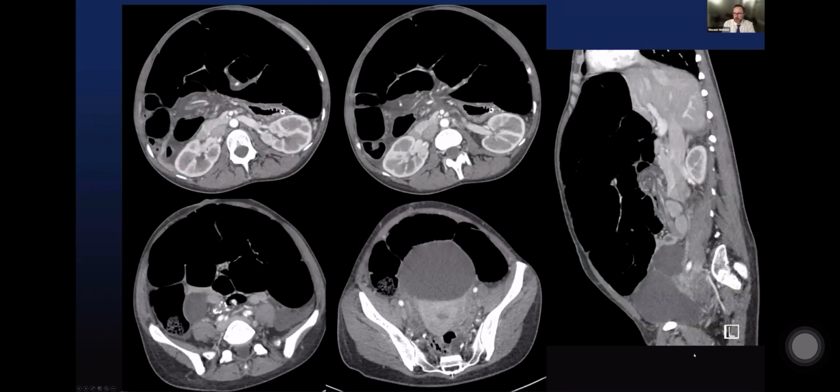So we talked a lot about abdominal wall hernias and causing obstruction. This slide I show to just demonstrate that we focus on things like internal hernias, and I'll talk more about that in just a moment. We focus on things that tend to cause ischemia. It's important for us as radiologists to remember that one of the most important causes of ischemia in small bowel obstruction is overdistension. And that makes sense. When someone has small bowel intraluminal pressure that is higher than the pressure in the capillaries, you can't perfuse the mucosa and ischemia results.